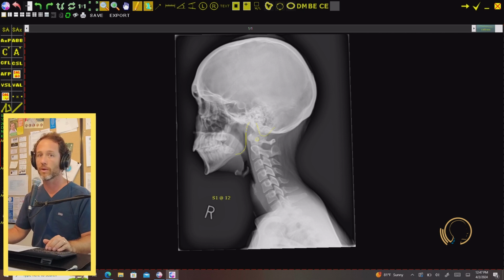So again, by way of introduction, we got 4 views. Sagittal, which if you're getting into upper cervical work, you could associate this with like a lateral. Frontals and axials, which are going to be on that Z-axis, and the horizontal top-down kind of Y-axis view. The sagittal, however, this is our X-axis view. This is the first view I'm going to take, right? It gives me the information to take the next view. And it's also the last one I end up analyzing when I'm digging out the transverse process location.